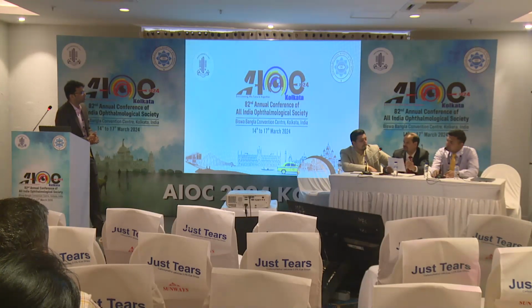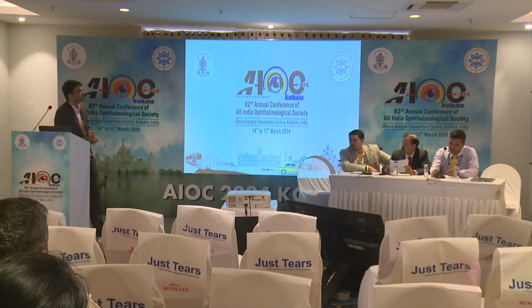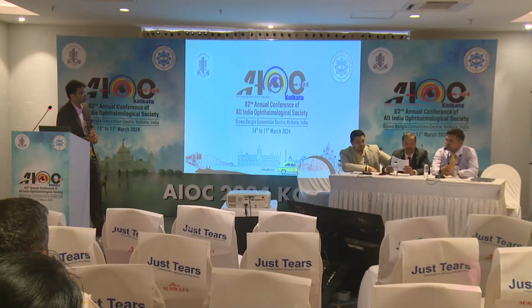So one category of cases you want to say is when you have macular neovascularization or neovascularization due to any cause. Second would be the CNP areas. We can pick up the macular ischemia also on OCT angiography. Need not go with fluorescein angiography in maybe old BRVOs, when we have suspicion that it could be an old BRVO, vision is unexplained. So we can go ahead with OCT angiography and look for macular ischemia on that. Okay. Thank you.